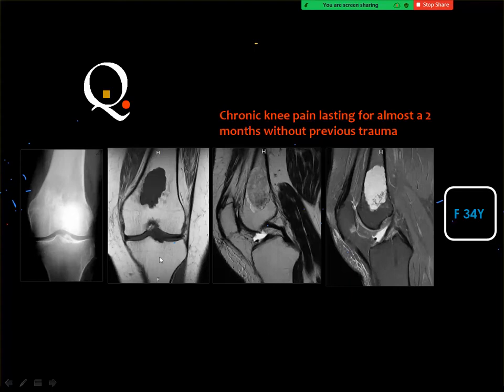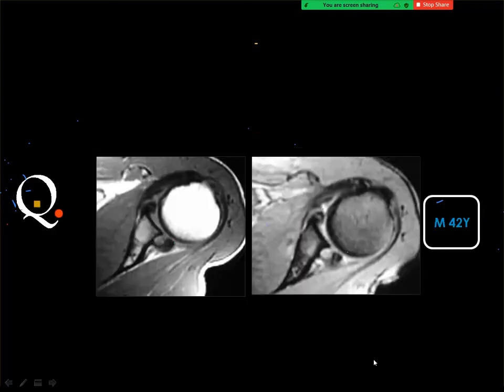But you remember that I mentioned in the lecture of the knee joint that you may sometimes incidentally find this lesion, which is located intramedullary. It shows low signal in T1 and relatively bright signal in T2, with very bright signal in the STIR images, together with dark foci within the lesion representing calcium, and this is enchondroma of the long bone. Yes, and this is the next case.